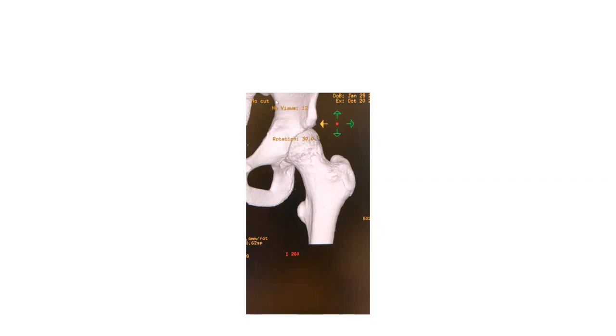You might close reduce them, okay? This is an adult, this person's getting surgery, okay? That's a surgical fracture in an adult. They get 2 plates applied, like you see here. If you see that same pattern and say there's growth plates like you see here, and that fracture is displaced like that, how does that fracture get treated?